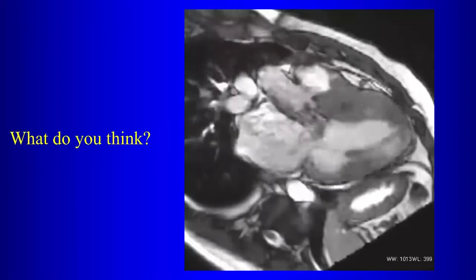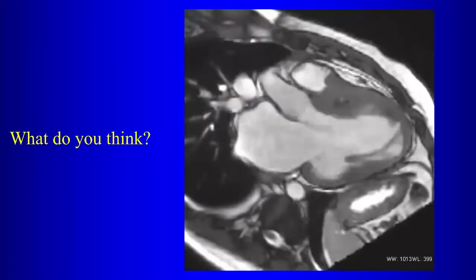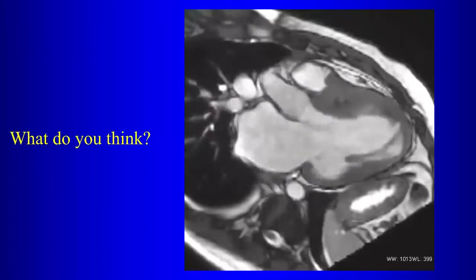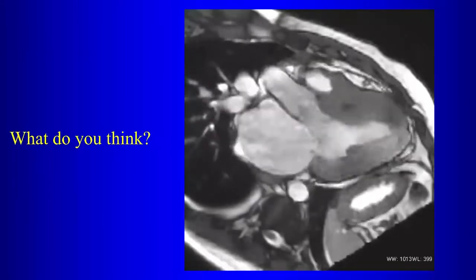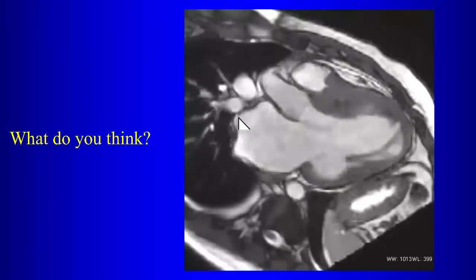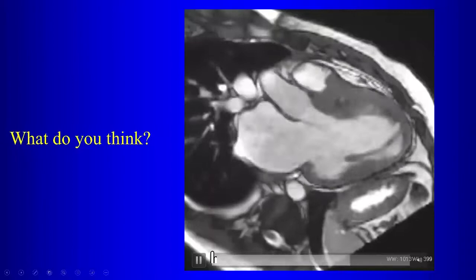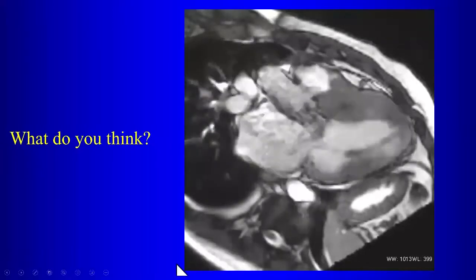All right, what's the bonus finding associated with HOCM? Who's taking the boards this year? Come on. Is there another flow disturbance? Look carefully. Mitral regurg. There's a little flash. See that little flash of mitral regurg? That is associated with HOCM.